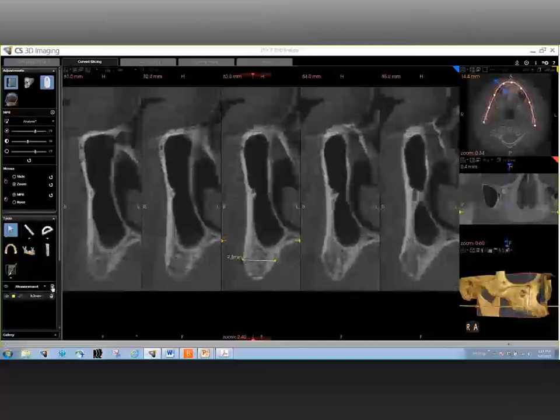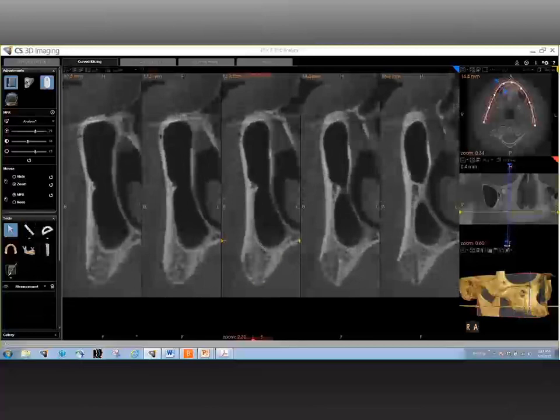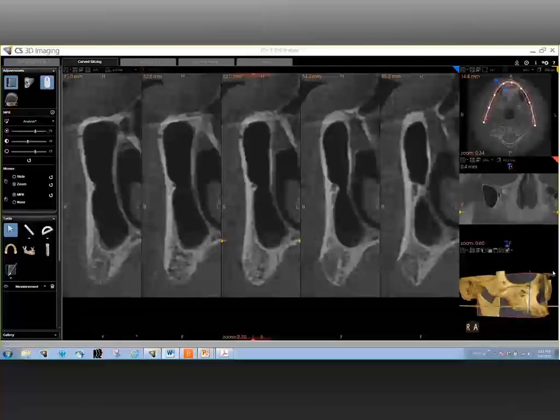And now you see there's even better gain. Even the quality of bone has increased in there. You see more trabeculation of the bone. You see that the cortical bone seems to be a little bit more intact, and those kind of things. Now, the key point to note is that just on one side of the patient, you've seen the variation all the way from non-existent ridge to ridge that could go up to like 8, 9, or 10 millimeters in height.